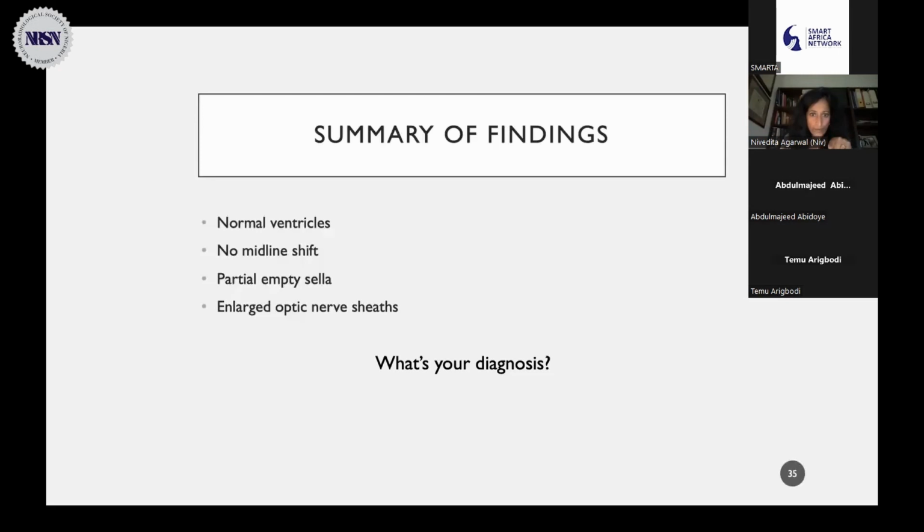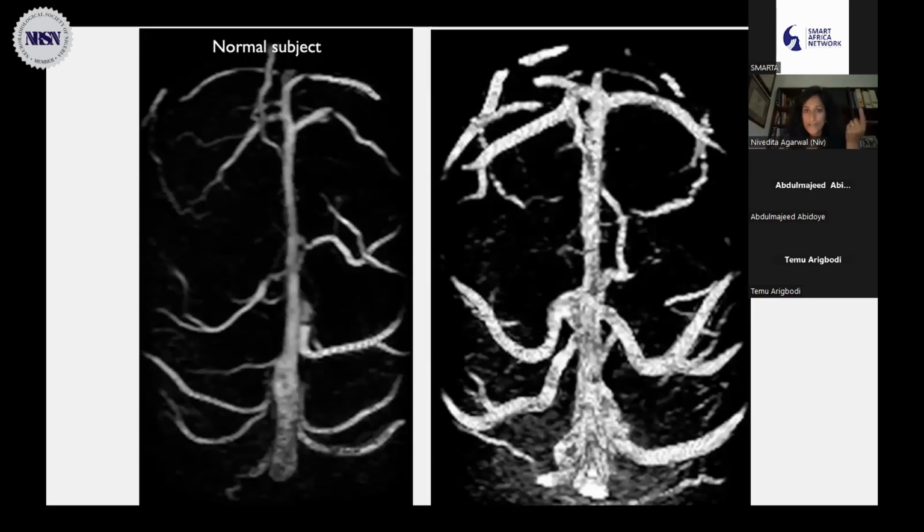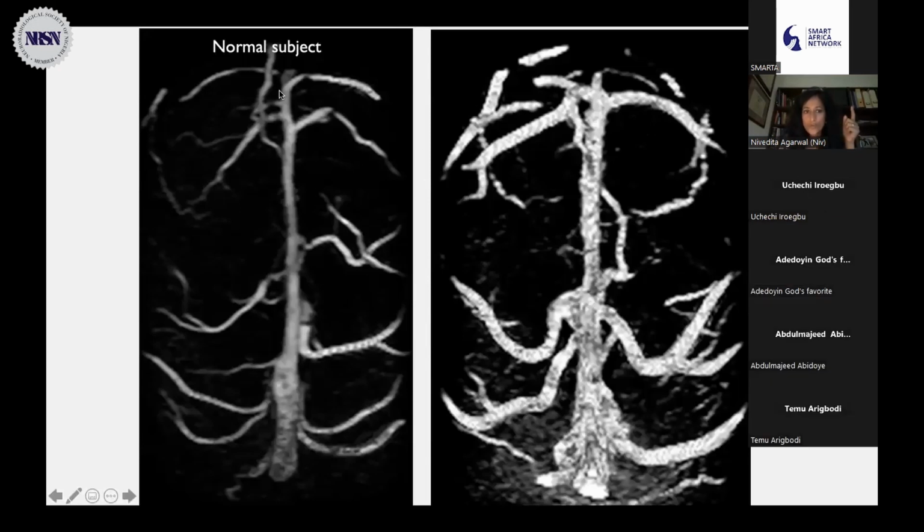All right. So, well, I've already given you the diagnosis, so we can go to the next. And because of the knowledge that I had prior to this, we did actually a second MR and studied the veins. And if you look at the superior sagittal sinus veins in a normal subject, you will see that this patient definitely had a lot of venous blood. So the increase in volume inside her brain was because of the venous blood that was basically stagnant. It was not able to flow out. And so that volume is increasing the pressure, the intracranial pressure.